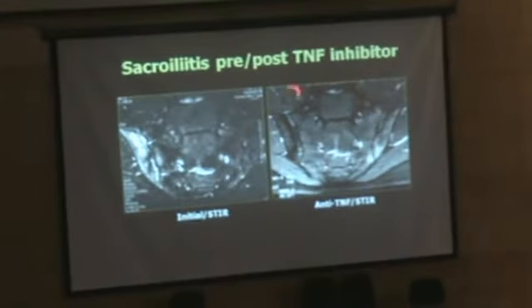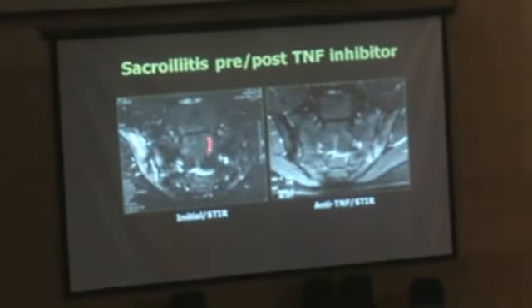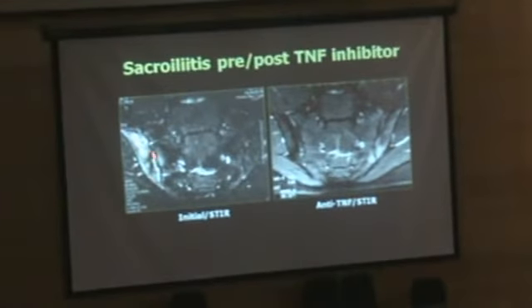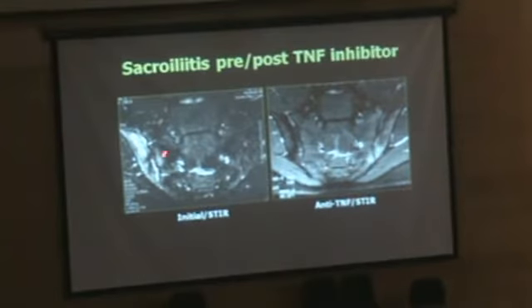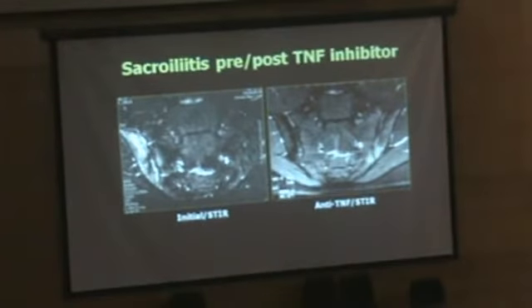And this is an example of a subject. He was diagnosed with ankylosing spondylitis. So initially he has this very important right sacroiliitis with a lot of bone marrow edema, high signal intensity within the joint, maybe some sclerosis or even some fat here. As part of the repairing process, we're going to see fat subchondrally. The left side is pretty much okay in that coronal STIR sequence.